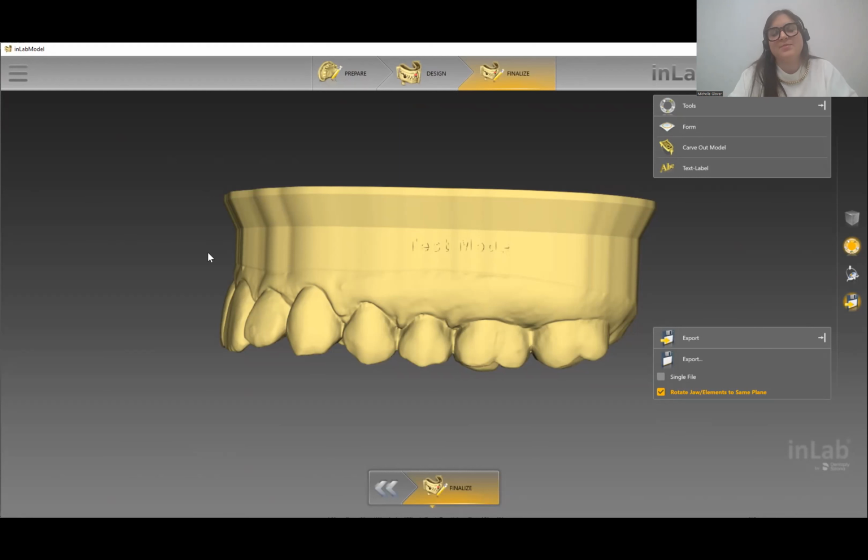So some people will say, worst case, if anything happens to that STL, I'll just redesign the model, right? But realistically, if you needed to reprint because something did happen at the time of cure, you can just send that STL file back. You don't have to redesign, right? So a model, because it's not really well involved, a lot of the times people won't save it. But at the beginning, if you want to, you have full functionality.